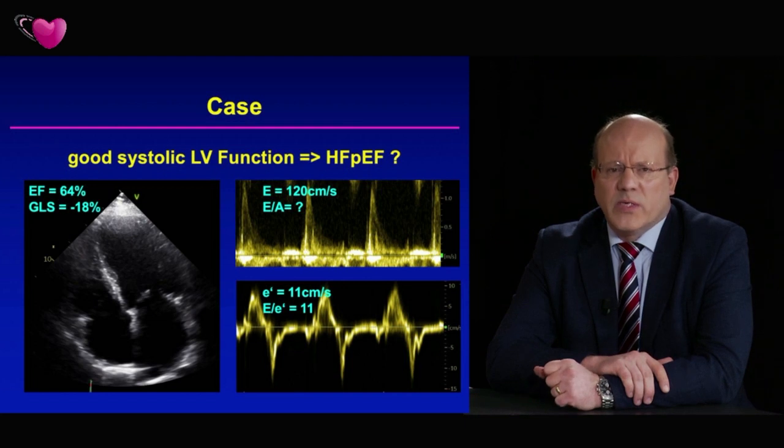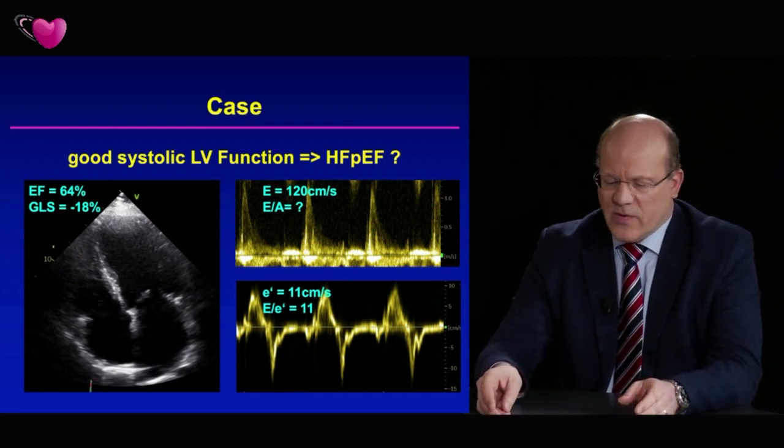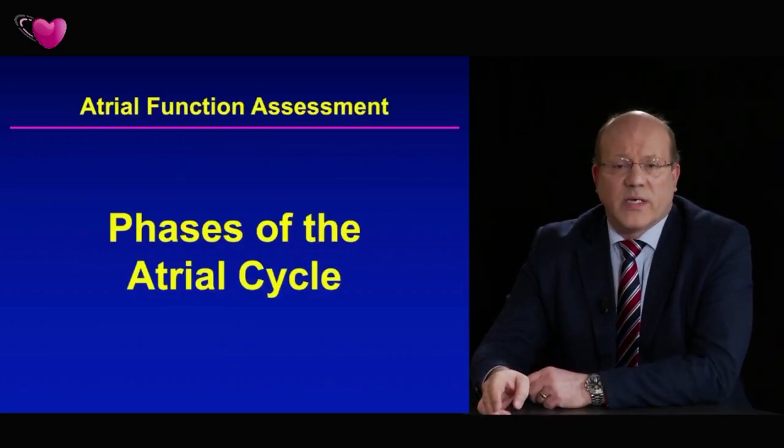So what's wrong with this patient? I would like you to keep that in mind. I will come later to that during my presentation and give you the answer what was going on. But now we are going to talk about atrial function and how we can assess atrial function.